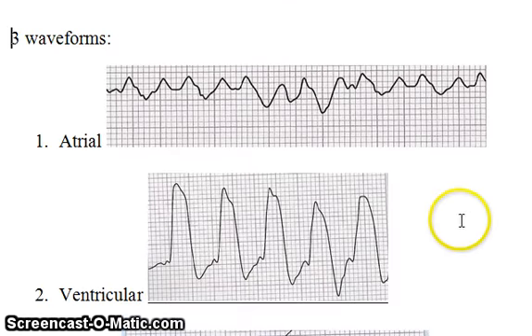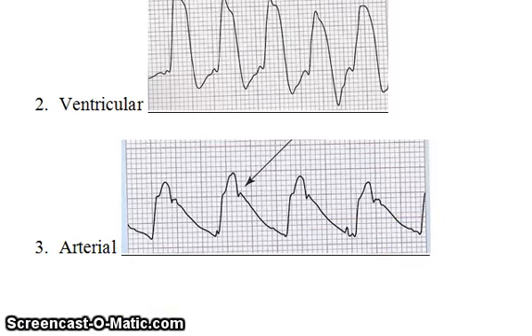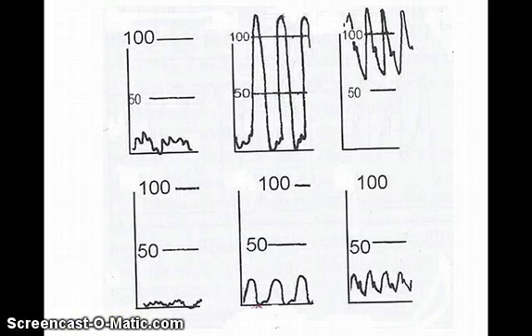Again, I just wanted to list all three together to demonstrate the three in close proximity. Okay, these I included for practice as well. So here we have double humped and squiggly, double humped and squiggly. These two are atrial, and so we need to know which atria. The scale isn't real good, but we can tell that this one's lower than this one. So this would be the right atria. This would be the left atrium.